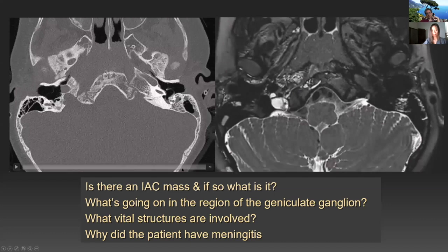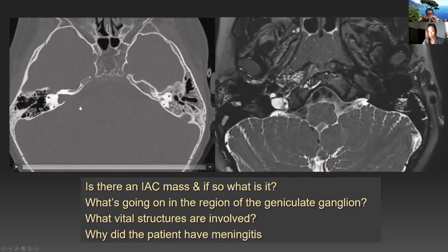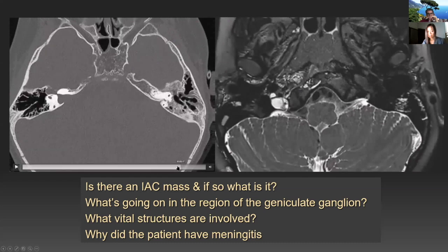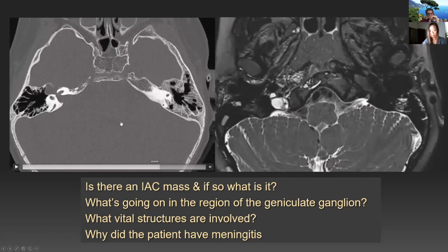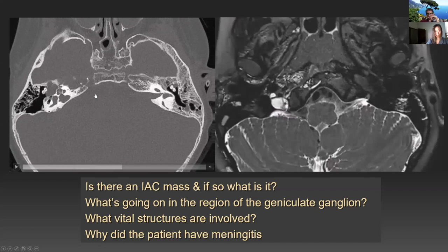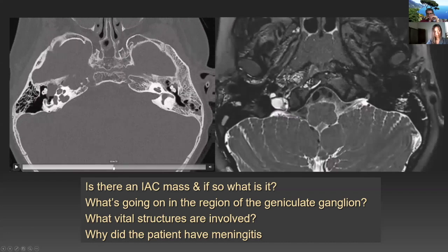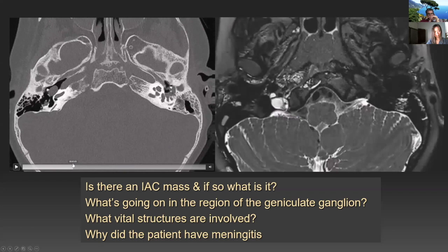Now, as we look at the accompanying CT, you can now appreciate the similarities to the case that Felice showed as his second case. So there is essentially a meningocele extending through the IAC to involve the facial nerve canal. There is erosion and remodeling, very sharply marginated remodeling of the right petrous apex. But the fundamental problem in this patient is that the bone itself is abnormal. And this abnormality involves both the petrous apex and the basal occiput.